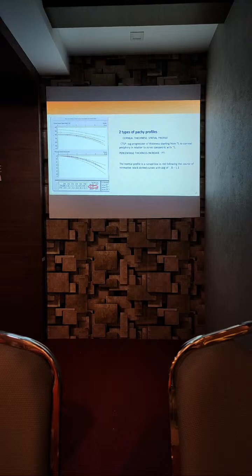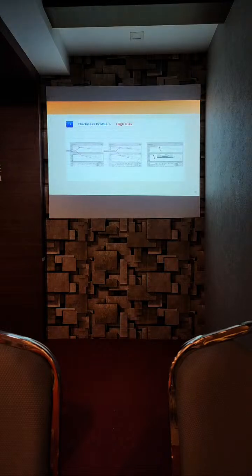In both the maps, the patient's line should go parallel to all these 3 lines. Otherwise, it is said to be a risk factor increase. These are the abnormal shapes: there can be a quick slope, or an S shape, or an inverted shape.